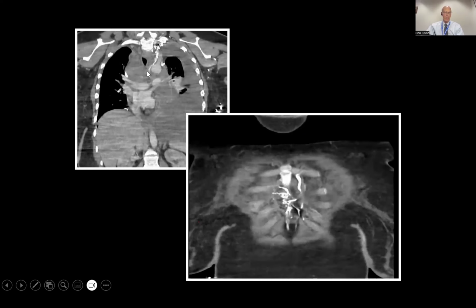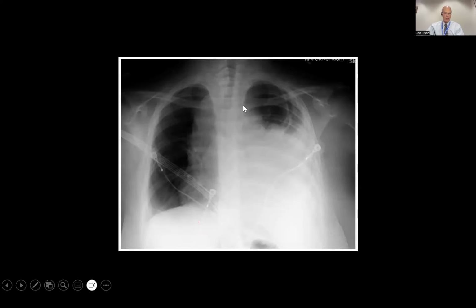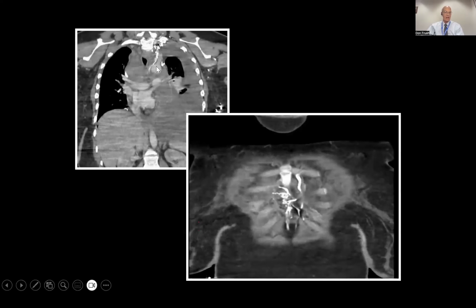And we got a CT of this patient here, and we'll go back to this. And you see this is a little bit wide right here. And we can confirm that it is not collapsed lung.